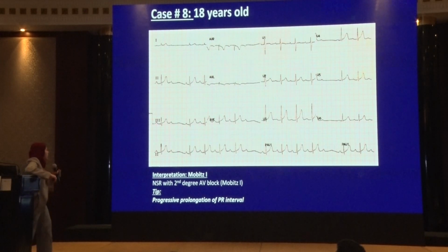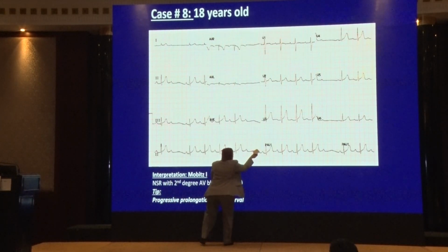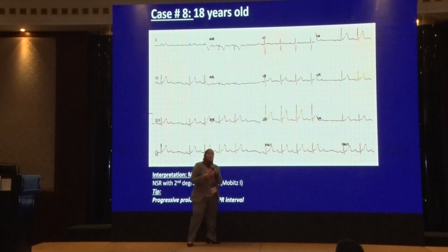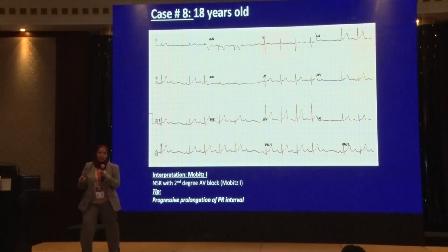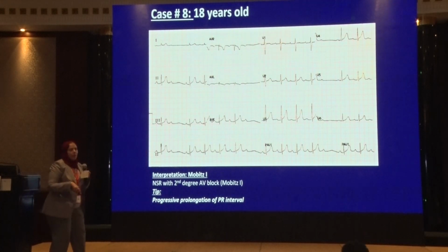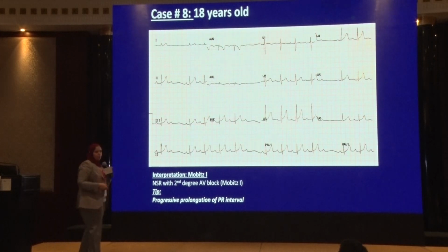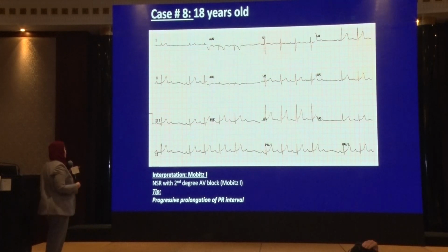So this is heart block. How do we know it? The most striking thing is from this part, when I have a P but I don't have a QRS complex, because as we said, in the normal criteria for normal sinus rhythm, I should have a QRS complex after each P. So I have here P waves that don't have a QRS complex following. From here I know that this patient has a problem with heart rhythm.